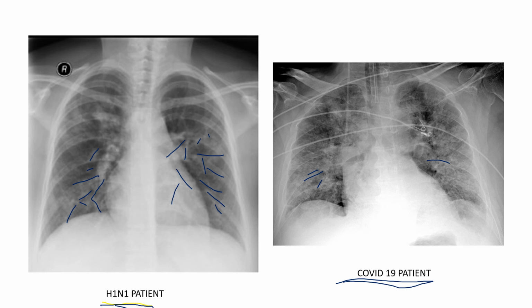Now here you can also see on this COVID patient on the right, you can see their ET tube in there, right there. So for an adult, you want the ET tube to be below the clavicles and above the carina. Roughly, it should be, according to Egan's book, 1 to 3 centimeters above the carina. In a kid, in a neonate, it should be just below the clavicle, at or below the clavicles and above the carina, because depending on how big they are, it's going to be different. So that's why we don't actually use a numerical measurement for kids. It should be at the clavicles or below, and then above the carina, which you can see here.